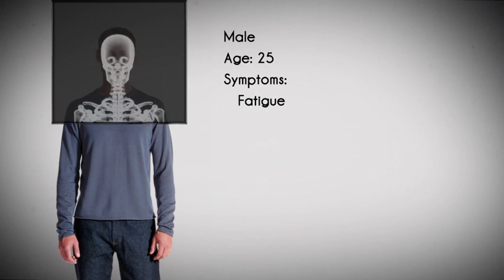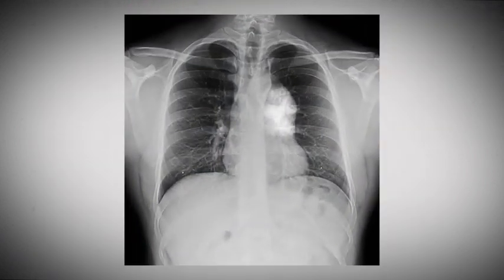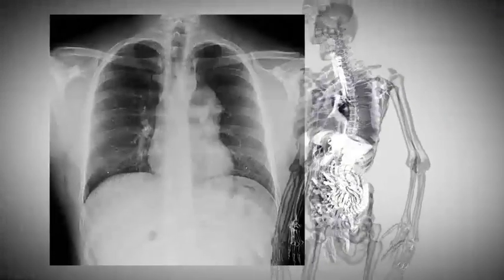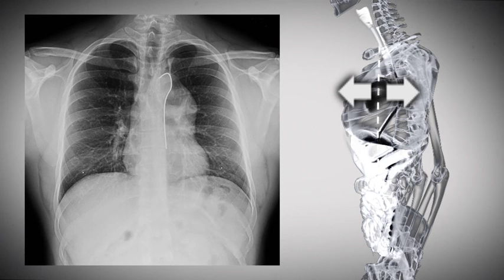The second patient is a 25-year-old man with fatigue. The radiograph shows a lesion obliterating or silhouetting out the normal contour of the pulmonary outflow tract. Should the mass be expected in the area of the anterior or posterior mediastinum? Since the aortic knob is still visible, as well as a portion of the descending thoracic aorta, this mass is located in the anterior mediastinum, not in the posterior mediastinum.